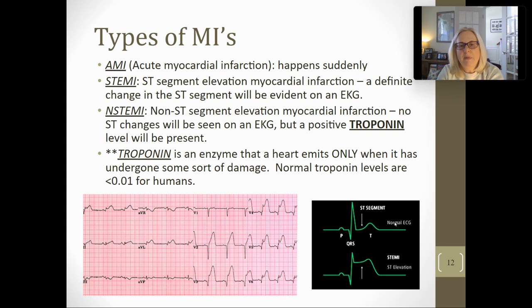Down here at the bottom, it's kind of cool. You can see PQRST. This is normal, right? Now look at the STEMI, the ST segment. This ST segment is well above the isoelectric line. See how high up it is? We call this a fireman's hat, or the EMTs call it a fireman's hat. If you've had Miss McVeigh's class, they call this a fireman's hat. This is kind of like the front of it, and this is the back of the fireman's hat sitting sideways. So a STEMI is a heart attack.